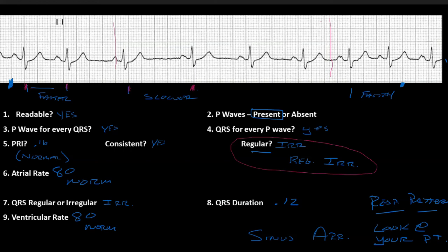See it once in a while. Not a lot of frequency that personally I have seen. I have seen it, but again, you may find this in pediatric patients, and you may find this in some older population because of the size of their chest.